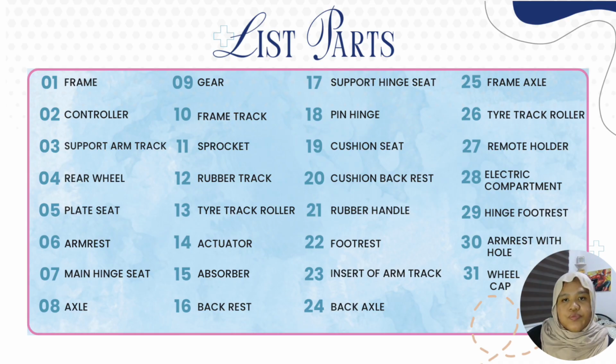The track system, which includes the frame track, track roller, and support arm, is designed to provide better traction and smooth movement while climbing the stairs. Components such as the actuator and absorber help to control movement and absorb shock for user safety and comfort.